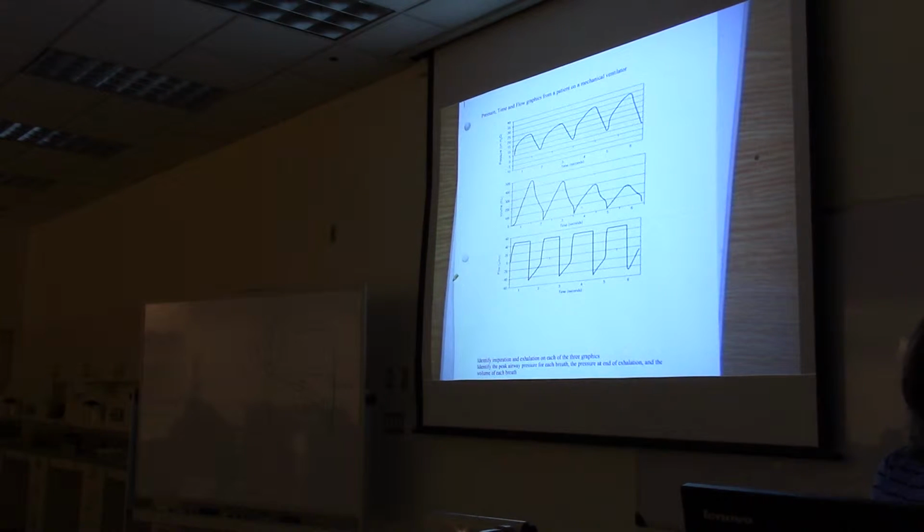All right, on the third graph, what is it measuring? Flow. And above 0, what is this? Inspiration. And then what's down here? The valve opens, and then the air comes back out. Exhalation. So where does exhalation end and inspiration begin on this one? At 0, yes.